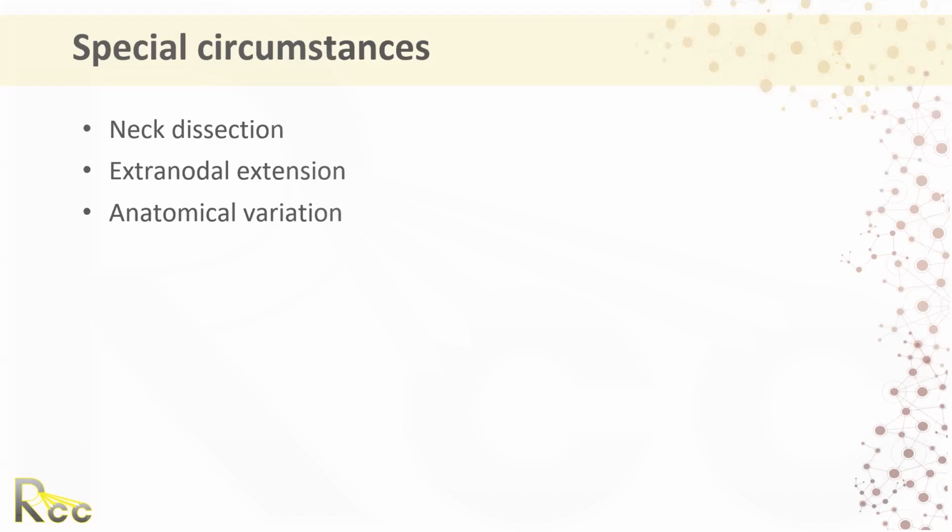But that's largely become historical. And all of our sites here at Mayo Clinic do whole neck IMRT. Okay. And then I have one more question here, and it is, when you treat level 4, sometimes you have to go so deep, close to the lung, to the superior part of the lung. So do you have any special consideration for that?